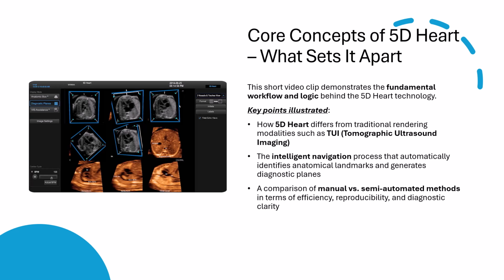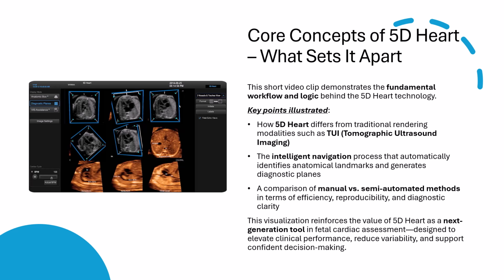The difference, it's night and day, not just in terms of speed and ease, but also in reproducibility and diagnostic confidence. Especially important when you are managing high-stakes cardiac assessments or teaching complex cases. 5D Heart is more than just clever software. It's a diagnostic partner, built to reduce variability, streamline workflow, and support confident, consistent decision making at any experience level.